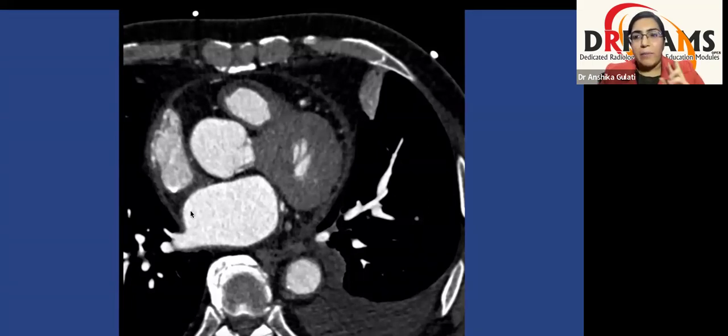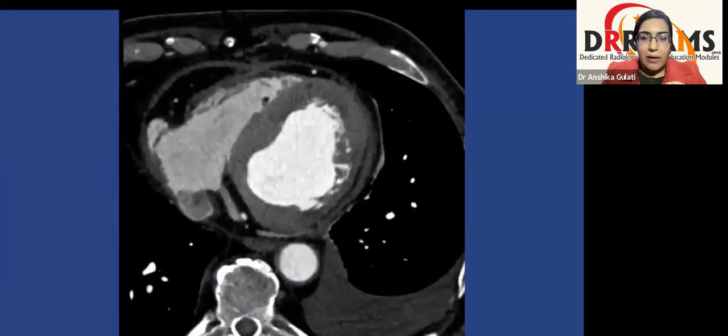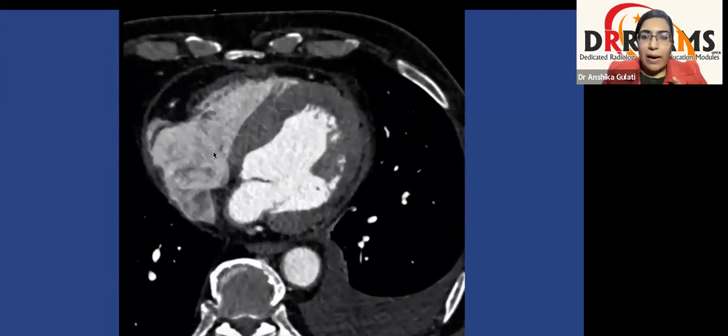So for right atrium, please remember these points. These are important for the morphological identification of right atrium. Broad-based triangular appendage with filling defects, with crista terminalis and the three main tributaries. Then coming to the right ventricle. This is the right ventricular cavity and connected to right atrium by the tricuspid valve.